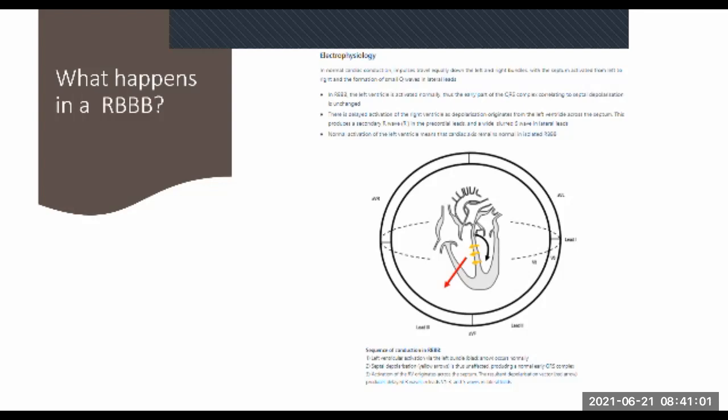If there is a history of ischemia or chest pain, and you do see a right bundle branch block, you should still be worried. It's not to say you should leave it alone, but generally it's of no significance if you just find it on a patient. So this is a nice slide, if you guys have a chance to come back and read the entire thing. My apologies that I'm going a bit fast. We've just got a few patients waiting.